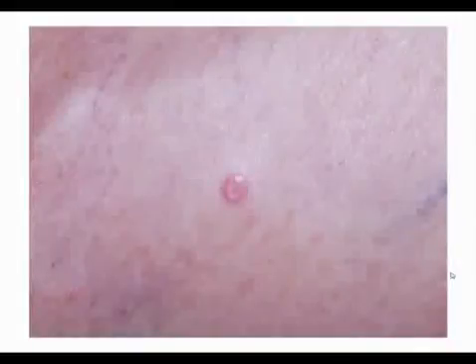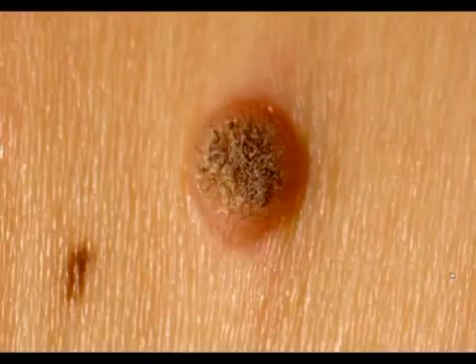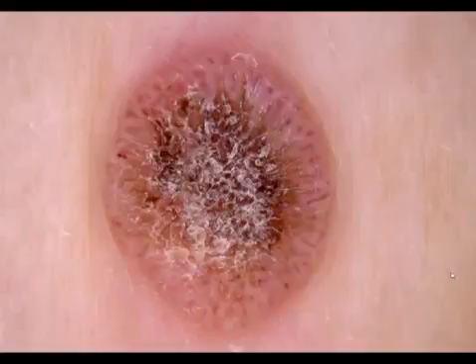Here's an example of a molluscum. Clinically and dermoscopically, you can see linear vessels. Some of them are straight, some of them are looped. Doesn't matter. Important is that the arrangement is radial, do not cross the center, and the direction is from the periphery towards the center. Here's another example. It's not a molluscum, it's a seborrheic wart, but you can see here looped vessels at the periphery, and the arrangement is radial.